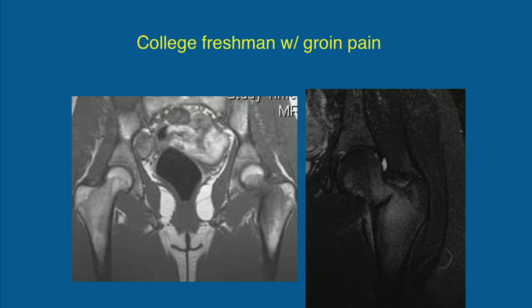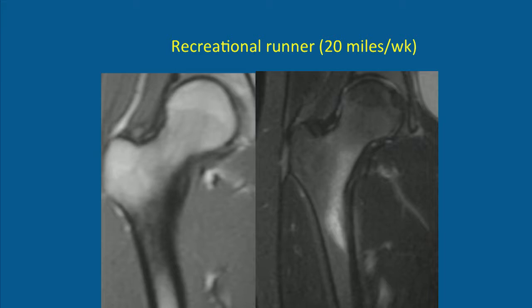Not too easy to see on the image on your left. That's a T1 weighted image, large field of view, but much easier to see the fracture line with the bone marrow edema on a fat-suppressed sequence, which we refer to in the musculoskeletal section as the cheater sequence. It means that basically we wipe out all of this signal, make the image dark, and so everything that's bright should conceivably be abnormal. But I don't want to give all of our secrets away.